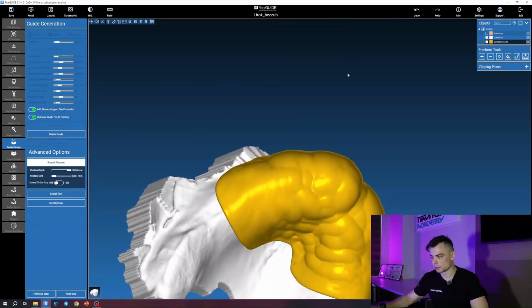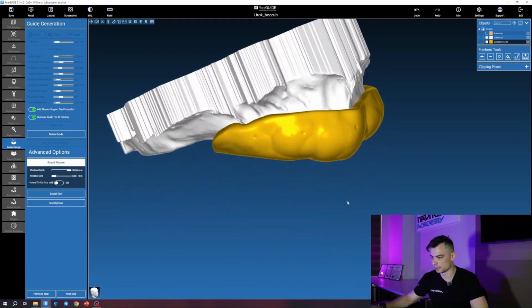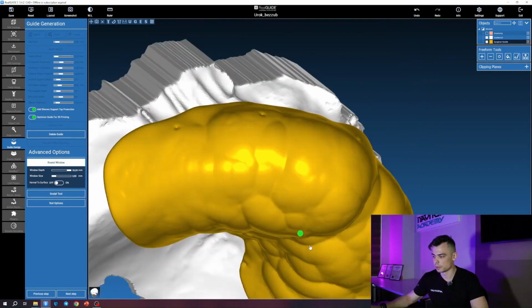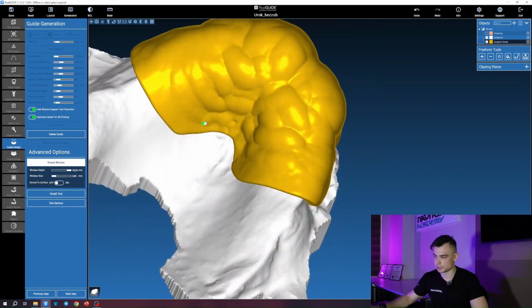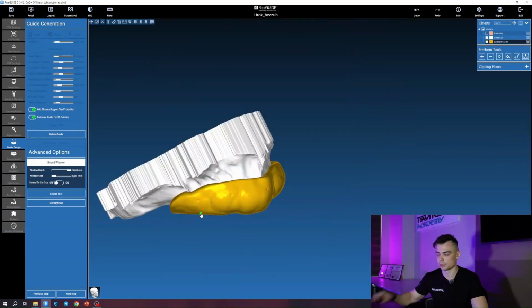And from a technical standpoint, that's not a very effective implementation. That's the first point. And the second point is that if you don't tilt them well, if you place the templates straight down from above like this, you'll end up with extra windows here, which you don't need. That is on the inside, because again, this green slider pierces through everything in its path perpendicular to your line of sight.